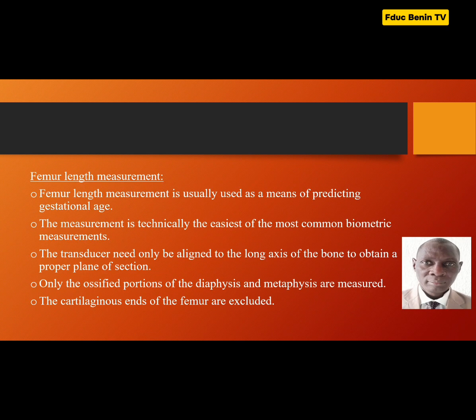Now, how do we measure the length of the femur? Femur length measurement is usually used as a means of predicting gestational age. And the measurement is technically the easiest of the most common biometric measurements when you are examining the long bones. It's the easiest when you are doing fetal biometry.